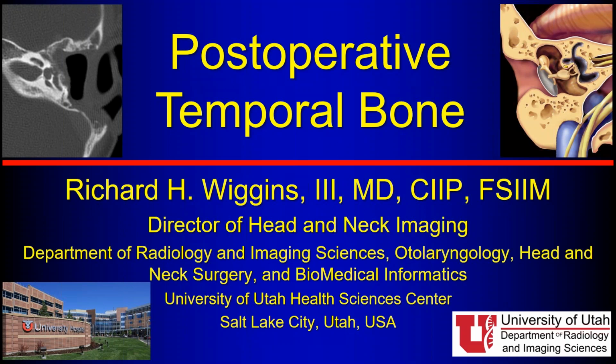But specifically with cholesteatoma post-operative cases, sometimes if somebody has an abscess, then we do see restricted diffusion, but that's a little bit different than a cholesteatoma case, where we're thinking about the restricted diffusion of a cholesteatoma more like an epidermoid cyst. So I would say that in the post-operative cases of a cholesteatoma, we do often use diffusion imaging to try to differentiate those cases, and that's where it's very helpful.